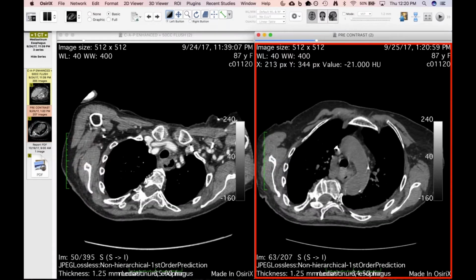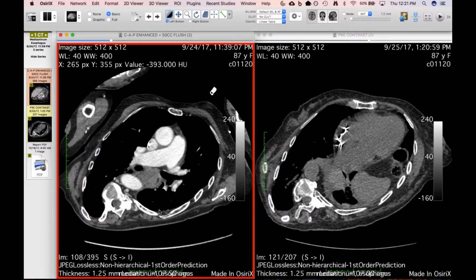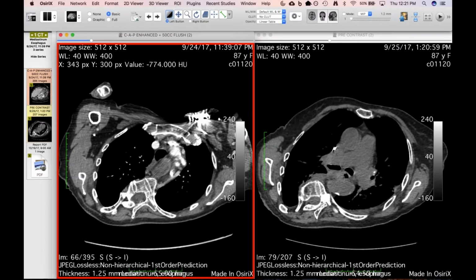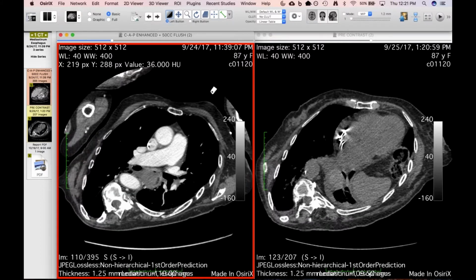I think we were all too fixed on cancer, but I thought this was one of those fibrovascular polyps, those enormous long things that people sometimes cough out that look like gym socks with their gym clothes. Right, that can sometimes have macroscopic fat and things in it. Yeah, no. So that was one of the things we were thinking on the differential, in terms of a mass. I mean, even lymphoma or something submucosal or just a really long leiomyoma, but this was just hematoma.